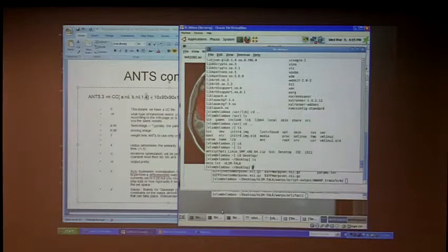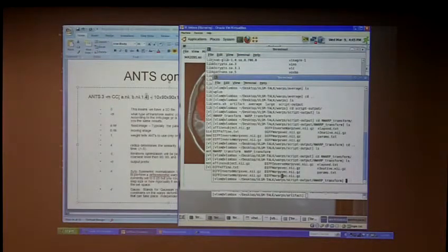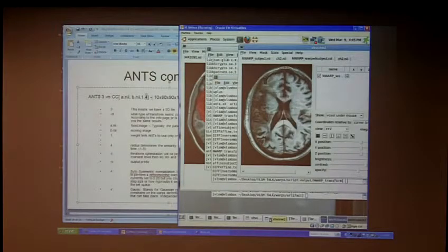It's when you get these subtle problems, like weirdly deep sulci, or the tip of some gyrus folded over into another gyrus, that you want to play with the parameters. There are a lot of parameters, but at first pass I would go ahead and try changing the iterations. Usually, with this script, it's fully expected that it's going to be an email or a call saying, hey, what do I do?